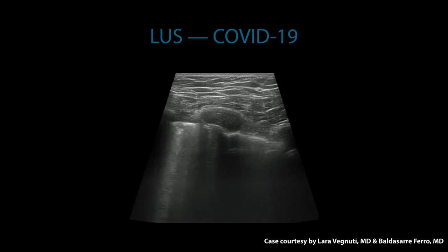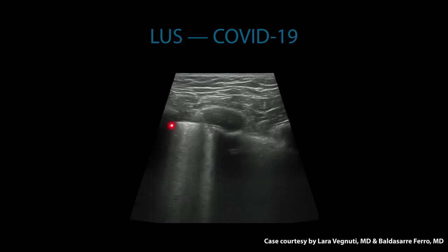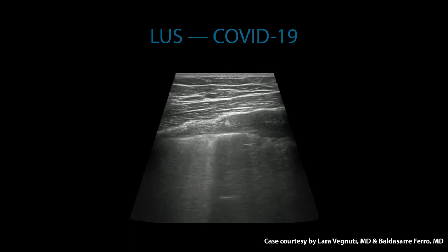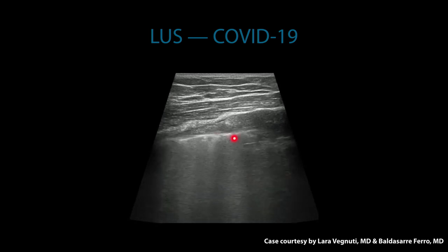We have to be aware, nothing we see is specific, but if we have a patient and a clinical picture, it's very suggestive. So B lines, remember these vertical artifacts. We have a somewhat irregular and thickened pleura and small consolidations over here. The same we can appreciate in the next image. We have a thickened pleura. You have the feeling that lung sliding is reduced, and also these vertical artifacts can be seen, and additionally, some really small consolidation areas.